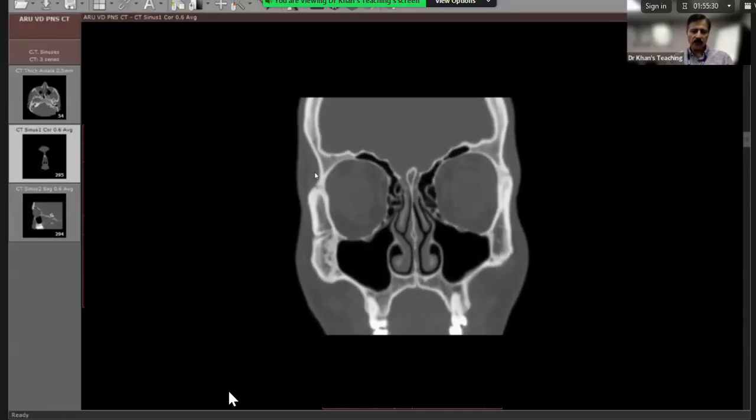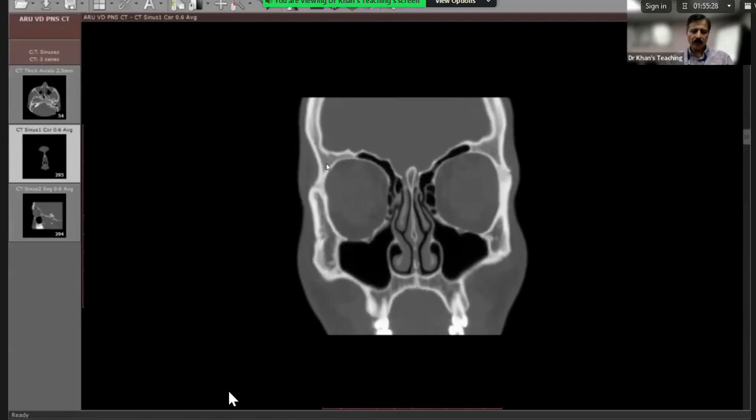So here is the frontal bone, and there is a suture here, the frontozygomatic suture. The frontozygomatic suture is an exam suture, and they will show you cases of trauma. And there is a concept of Le Fort injuries, where this is the lateral wall of the orbit. This is the medial wall of the orbit.